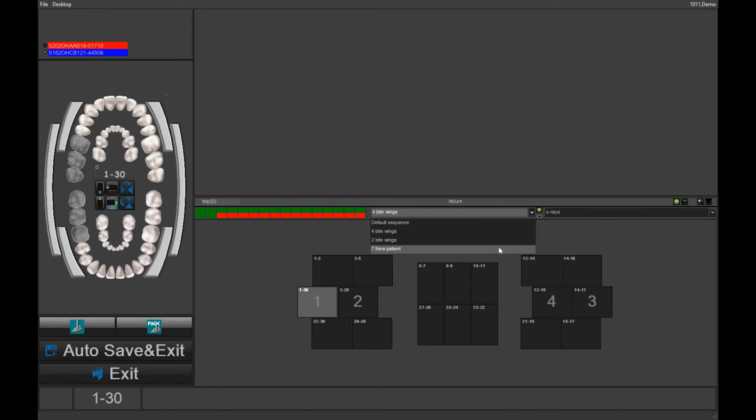You can create anything that you want. Here's 7. I can do a whole FMX. Now, something that I get asked a lot.